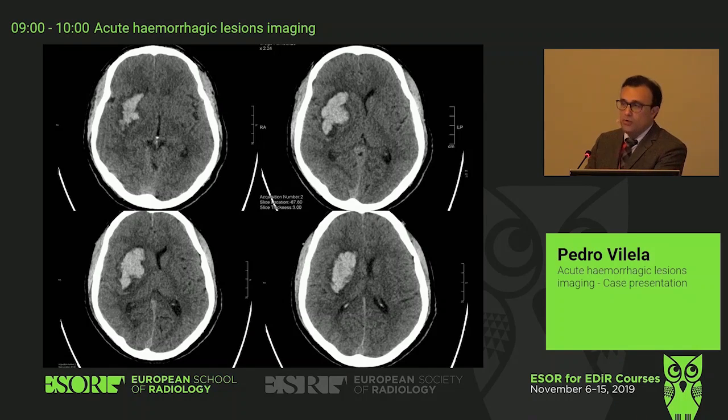In most places we don't do additional investigation, with the exception of follow-up. So what are the prognostic factors associated with an intracranial bleed that we need to report or exclude? So we need to say the size of the... It has mass effect. The mass effect. And does it have mass effect? Yes, you have midline shift. You see, you have some brain herniation.